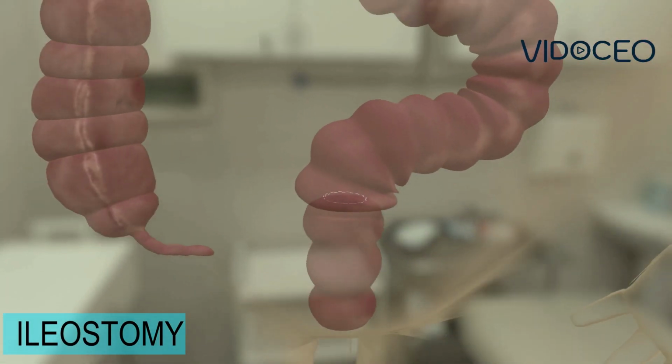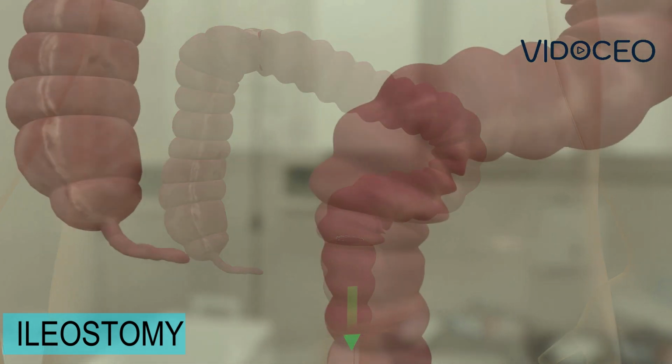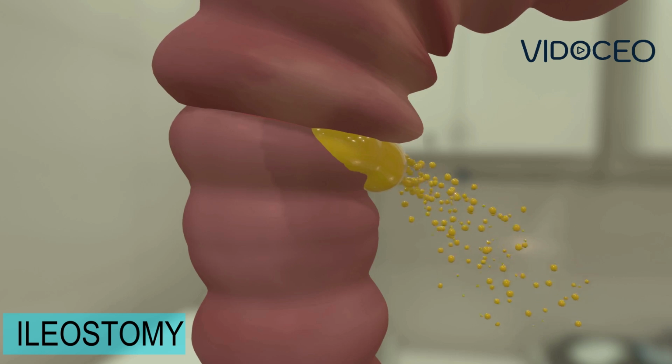During surgery of the colon, the new reconnection of the colon is often performed using stapler devices, or, occasionally, stitching. The new reconnection of the bowel can sometimes be deemed by the surgeon to be at higher risk for possible poor healing and leakage of bowel contents.